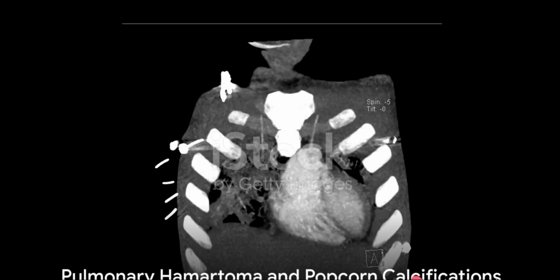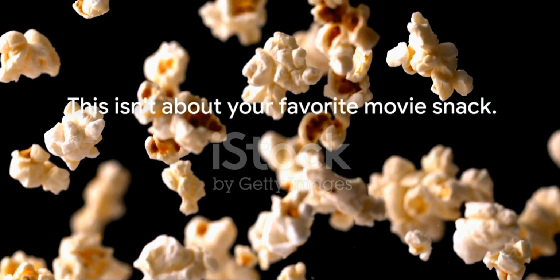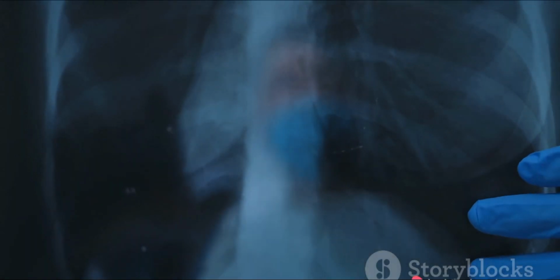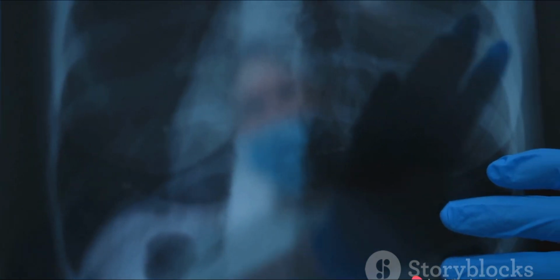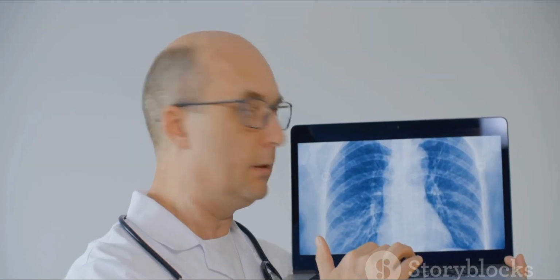Moving on, we encounter pulmonary hamartoma, a benign lung tumor. This condition is linked with popcorn calcifications. Now don't let the term confuse you. This isn't about your favorite movie snack. Instead, this term refers to the unique pattern of calcification within the tumor that resembles popcorn on a radiological image. It's an unusual, yet remarkable sign that helps in diagnosing this condition.